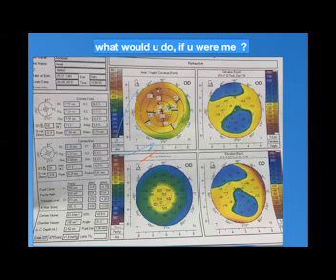At the same point of the thinnest location is a steep reading, which is 48.3. The anterior elevation is minus, and the posterior elevation at that point is minus. But you will go for PRK, right? Right.